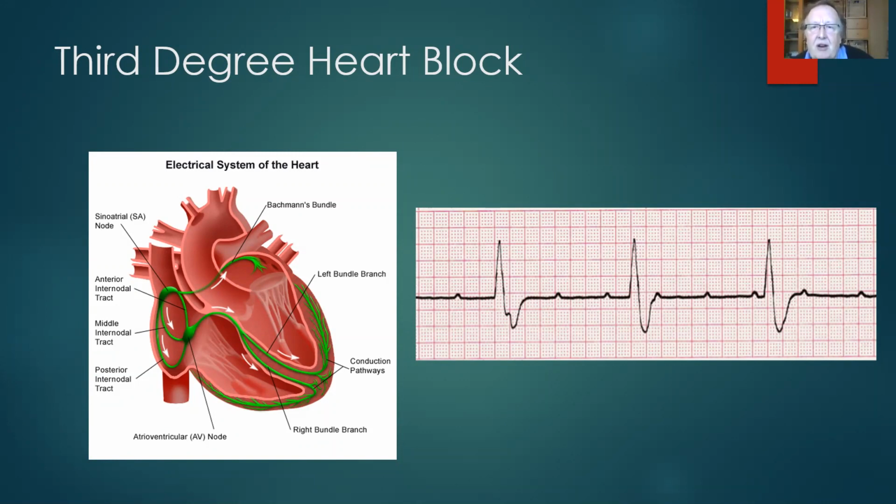Is the QRS complex of normal duration? Oh, no, it isn't. So where we see the big complexes, we can say that they are ventricular. Is the T wave normal? No, it's upside down because ventricles that contract abnormally relax abnormally.